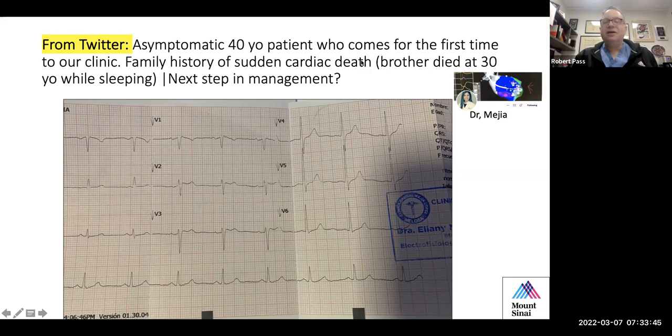Family history of sudden cardiac death. Brother died at 30 while sleeping. What would be your next step in management? So let me ask Dr. Kong what her thoughts are on this tracing.